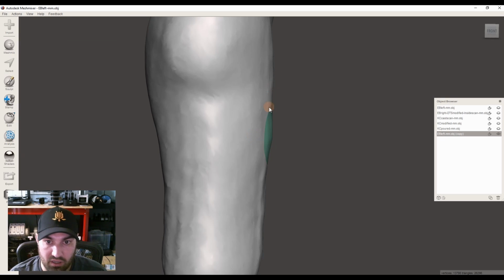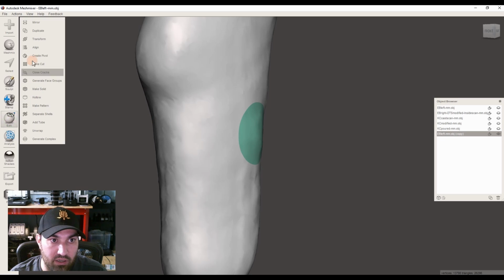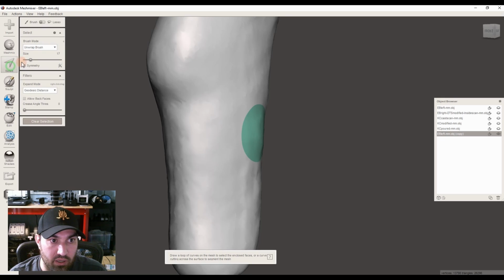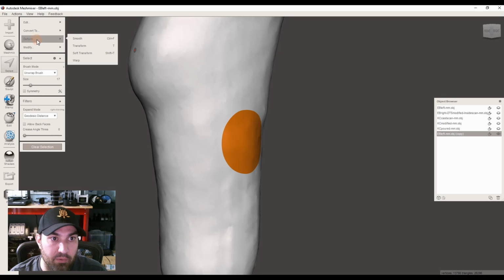So first thing we'll do, select, double click that, and then there's 2 different edit menus. So when you're in selection, it's going to pull up that one. The other one here, we've gone through with like transform, some other tools we'll get back to. That's the regular edit. What you want to do some of these is you have to select something and then it pulls up this menu.